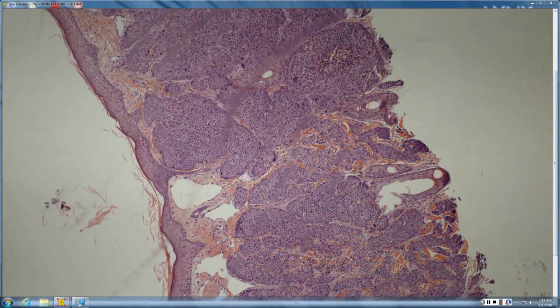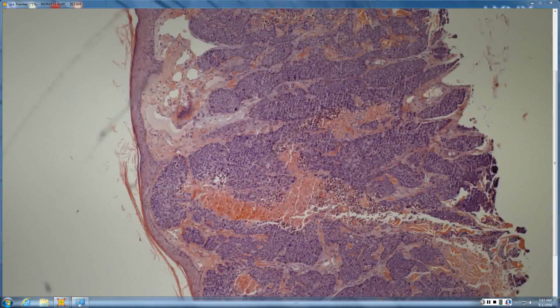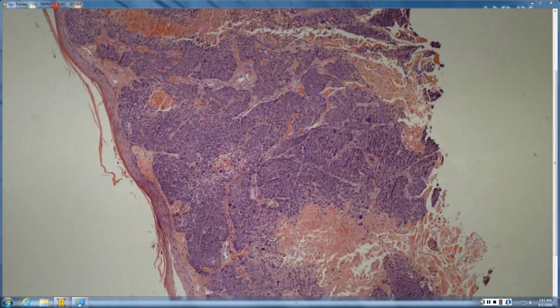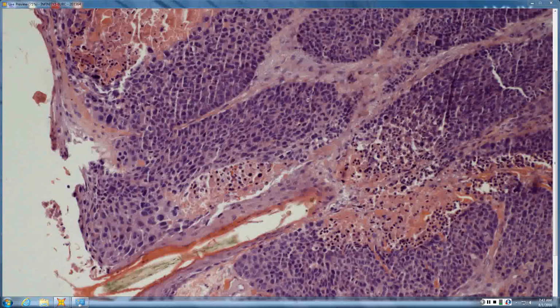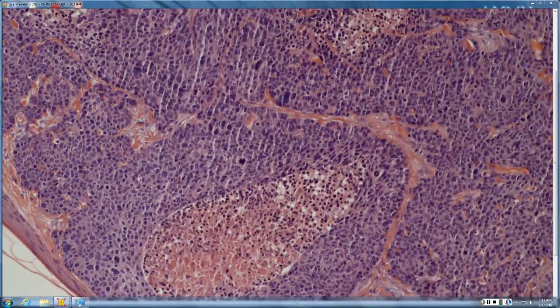Okay. So Dan, this is a predominantly small blue cell tumor in the dermis, although some of them seem to come from the epi, so I'm favoring squame. Yeah, some of them seem to come from the epi, but they're very blue, right? Yes. The other differential would be Merkel, maybe, but I'm still favoring squame.